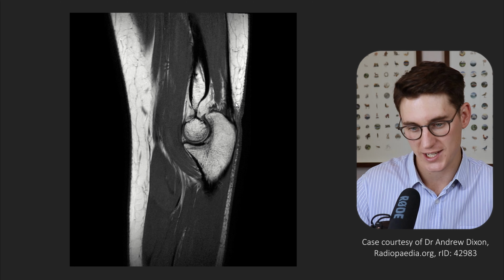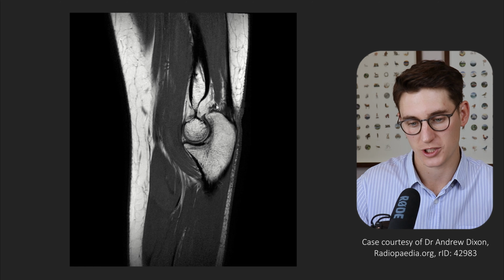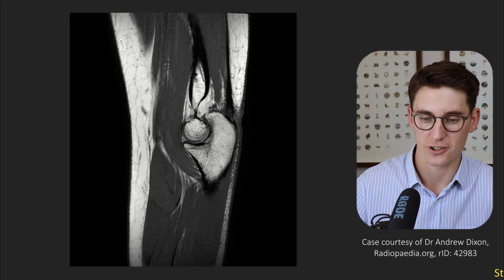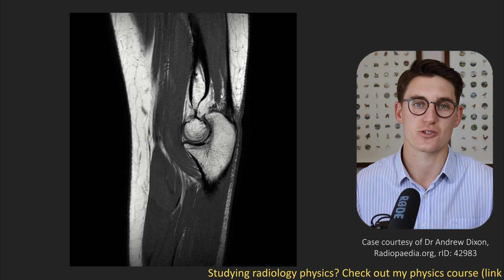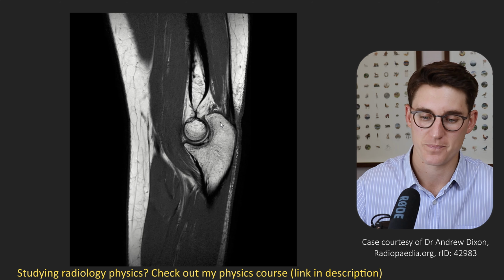So it's really important to assess whether the tear involves both the muscular and the tendinous section or just a partial tear through either the tendinous or muscular sections. This is our lateral and our long head of tricep making this tendinous section. And then our medial head, the one that lies deep to the lateral and the long head of triceps, then gives us this muscular attachment onto the olecranon here.